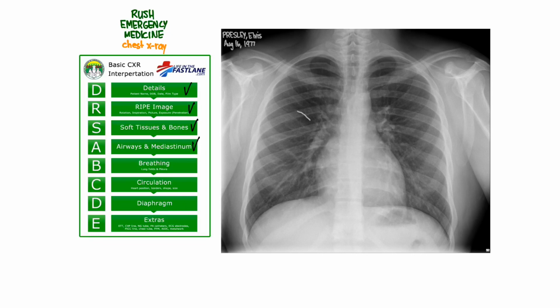And you can see these very faint lines that are kind of going out to the side. And you can see them kind of going all throughout the lung. They're much thicker along the bottom and much thinner along the top. And that makes sense because gravity is pulling the fluid downward, and so you're going to have more fluid near the bottom. But you should see this getting up to the pleural edge.